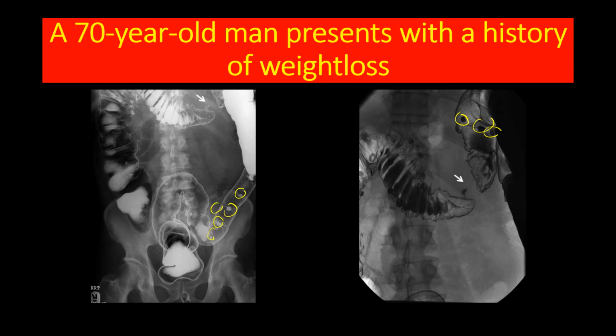So there are a few diverticula, and there is a circumferential narrowing of the mid transverse colon, which is looking like an apple core appearance. Based on these findings, I feel that this might be a case of colorectal carcinoma. However, there is no obstruction caused by this lesion because there is no gross dilatation of the proximal bowel loops.